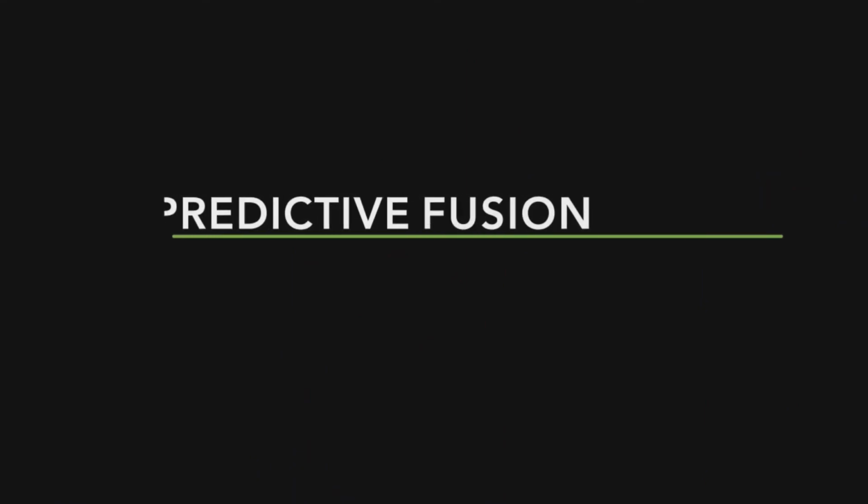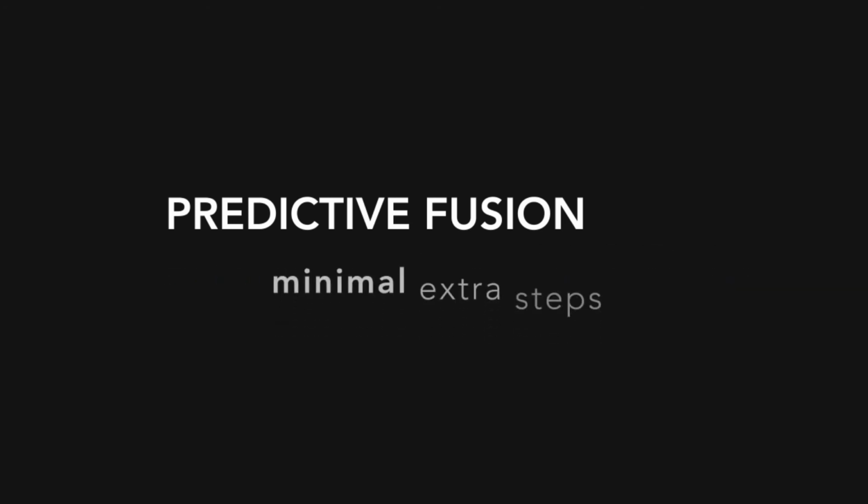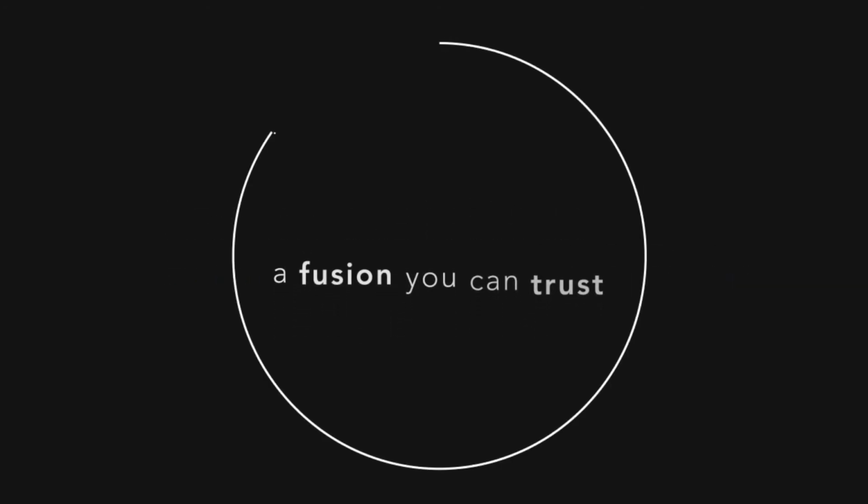Both rigid and elastic registration significantly improves prostate biopsy, and the literature shows neither is superior to the other. Predictive Fusion, however, was uniquely developed for the specific task of fusing prostate MRI to ultrasound. Predictive Fusion was designed to closely fit your traditional biopsy workflow, requiring minimal extra steps and saving you time while providing a fusion you can trust.